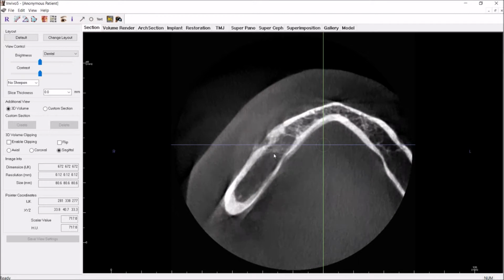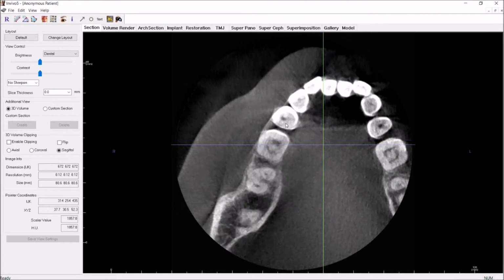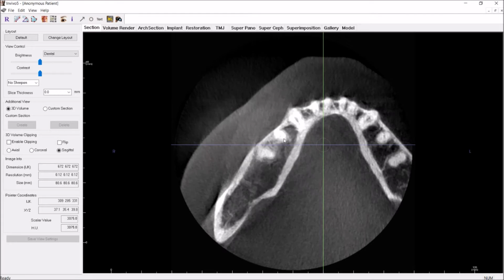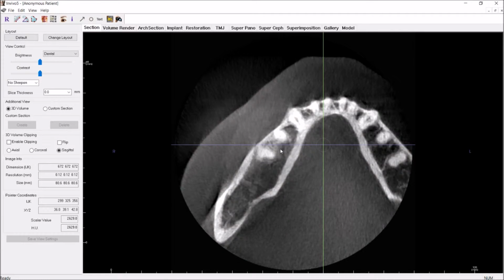You describe where it's located. Of course, it's around the apices of these two teeth. These two, we got a premolar and a molar here. So you may already know what that is, but I'll let you give your differential in a second here.